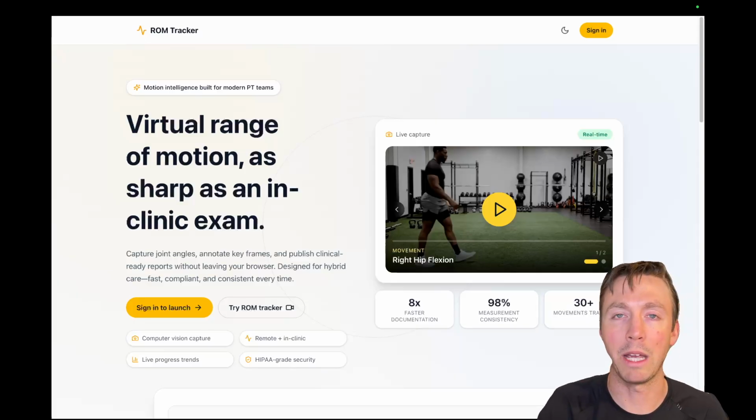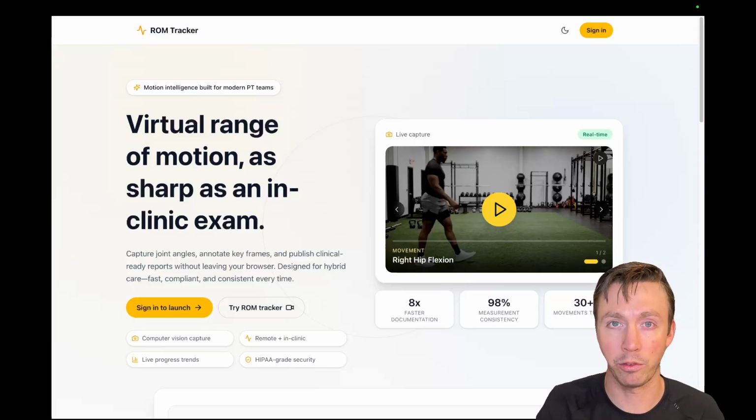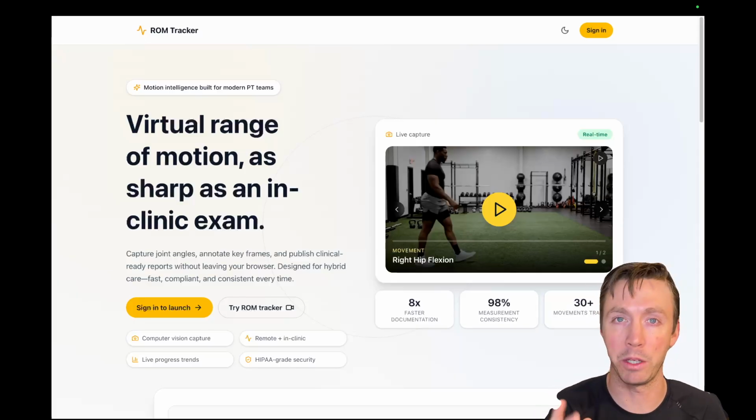This video is going to be a brief demonstration on how to use our software, its utilities, and how it might be useful for you.